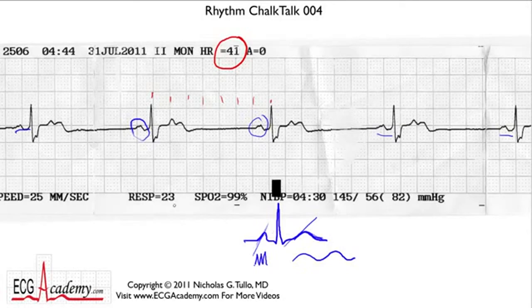When we go back to this EKG, we'll change color just to provide a little contrast. Here's the P wave and the QRS, and everything looks fairly normal. But when you look at the T wave, it's by no means smooth. These T waves are very bumpy. It looks like a camelback. And what you need to be able to recognize is that this is clearly a very abnormal looking T wave.